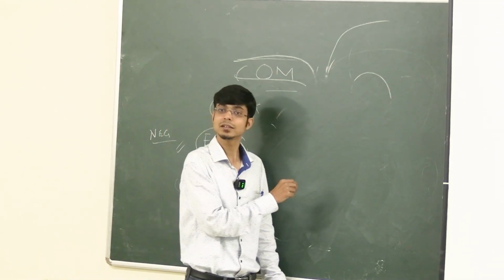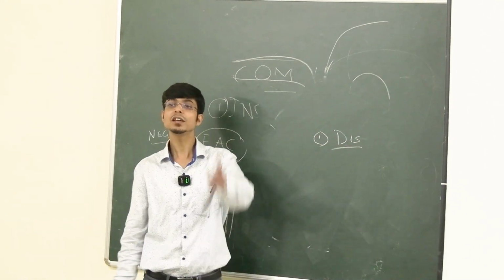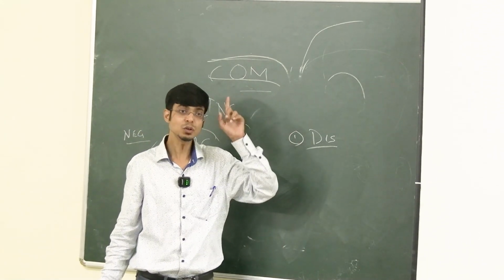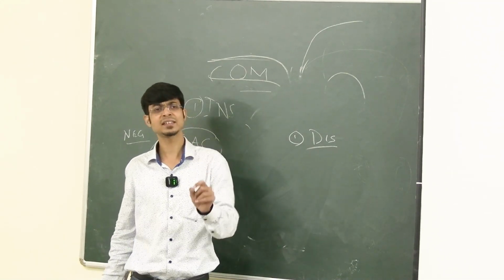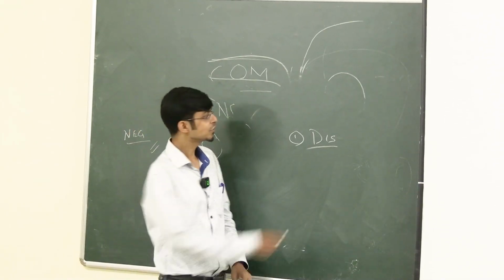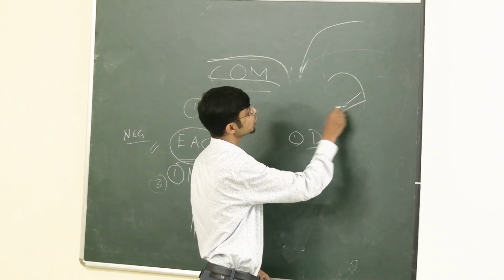There is a fracture, so what we assess is dislocation. If the nasal bone is comminuted and dislocated, then we need to intervene, reposition it and correct it. Many a time we see the X-ray and say it's fractured but not dislocated, so you don't need to do anything. See, the nasal bone looks like this on the X-ray, no? So there is a fracture and this bone has gone like this.